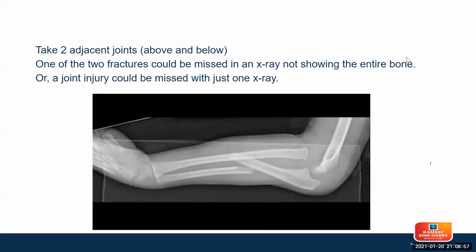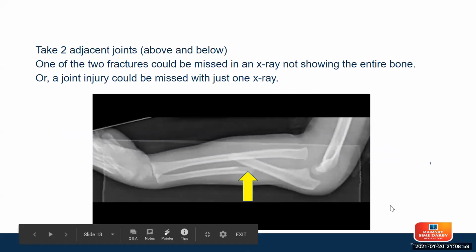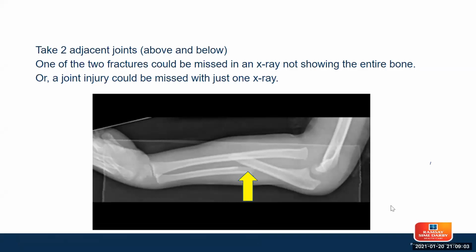Most people would say there's a fracture of the... I can't ask anyone questions, can I? It's a fracture of the ulna. Oh, can. Right? Okay, yeah. You can. Oh no, they can't answer me immediately. We have been doing it quite well. What you do is you ask them a question and they will all type in the chat. I have to read it. Okay, anyway. Yes, I will read it. All right. Okay. I'll explain this anyway.